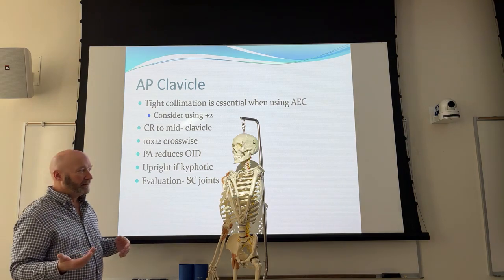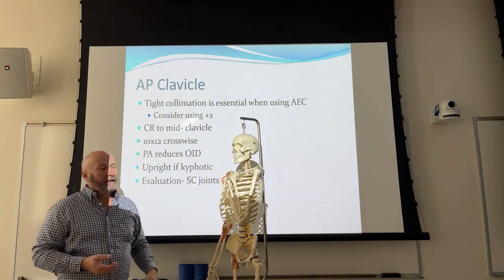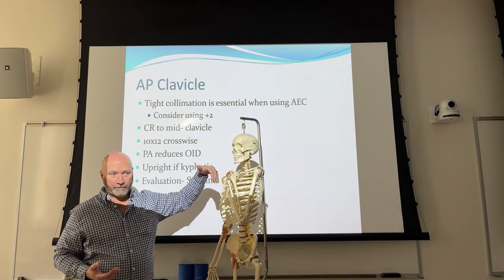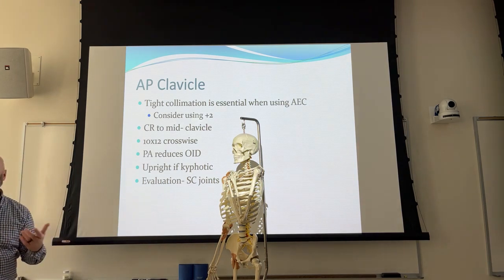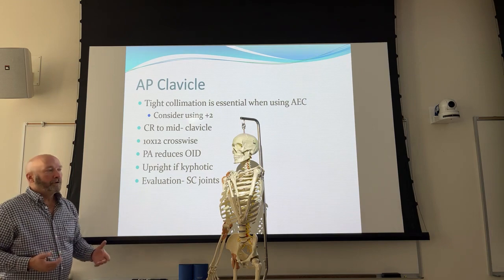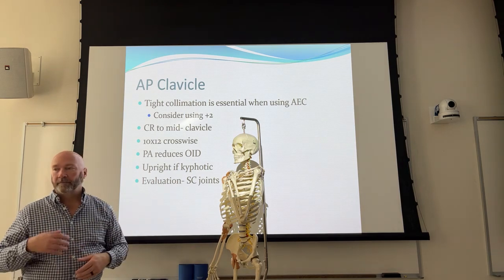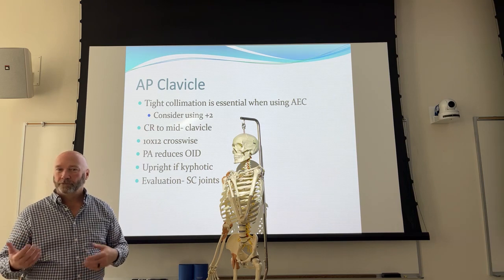Even though you have a cephalic angulation to project the clavicle above the ribs, really pretty much the only thing that it's going to catch is the lateral portion of the medial portion of the clavicle, if that kind of makes sense. And we'll take a look at two images on the same patient to help you get that. So what you're not really looking for is to project the entire clavicle above the ribs. You can put enough angulation to do that, but it's going to be a very steep angulation and it's going to look like garbage.